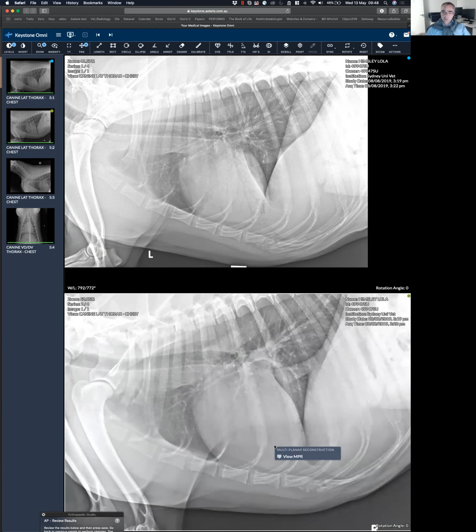So on this side, we see vessels, beautiful, wide vessels. In this one, we don't see vessels. We see what I joke about with students. These are kind of the anti-vessels. Make sense? Vessels are white. These are black. Do you see the difference?